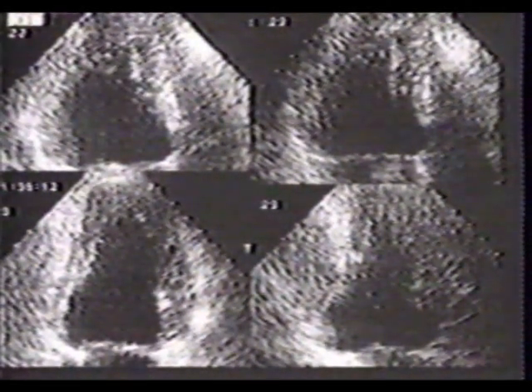This 51-year-old male was referred primarily for evaluation of hypertension. His ECG was interpreted as showing a possible inferior infarct. His standard treadmill exercise test was interpreted as being abnormal, but not diagnostic of ischemia. His rest and exercise apical 4-chamber and 2-chamber images have been captured with the frame grabber. His septum and lateral wall maintain normal contractility post-exercise. His anterior wall and infra-apical segment are also contracting normally. Therefore, there is no evidence of ischemia in the distribution of the circumflex or left anterior descending coronaries.